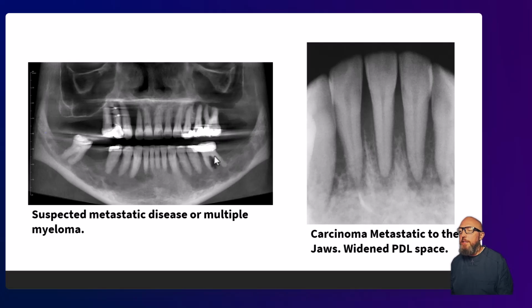All right, this was a case that I don't really have the answer for, but it looks like one of these things we've talked about. Looks like potential multiple myeloma, potential Langerhans, although this patient's a little bit older for Langerhans, right? So I think maybe myeloma or metastatic disease. If they had a history of one of those BLT kosher pickle cancers, then it's likely that recurrence, but something's going on that's not good in this patient. It's more than just typical periapical lesion or periodontal disease.